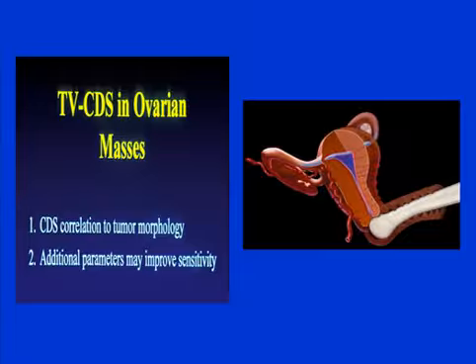As we know, color Doppler allows us to understand the physiology concerning blood flow to the ovary and other structures, and it is hoped that it improves the differential diagnosis of ovarian masses over that based on morphology. Morphology meaning assessment of tumor wall, tumor papillary excrescence.